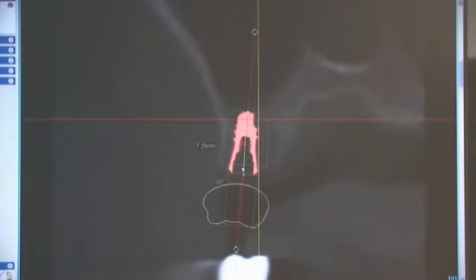Right. I think if you look at the virtual tooth, you're right down through the central fossa. It looks like you're right over the stamp cusp of the opposing. So I think that looks like a pretty good position. Beautiful. Okay, great. Then as far as from here, this is a great diagnostic tool. Then we can proceed however you'd like before the surgery. You could freehand this one based on the information you now have, we could make you a conventional surgical stent, or we could order a SurgiGuide from Materialize, and you can just let us know which way you'd like to go with that.